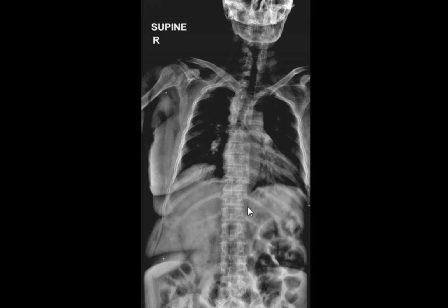So do you think anything looks interesting here or no? And if no, what to do? Here it's not very attracting, but I think if we look carefully, we can see something in these vertebrae that does not look quite right. They appear to be fused together. If you see on the lateral aspect, here there is something. Of course, it's not definite. It's not obvious even. But if we have to guess on something, then this would be our best guess.